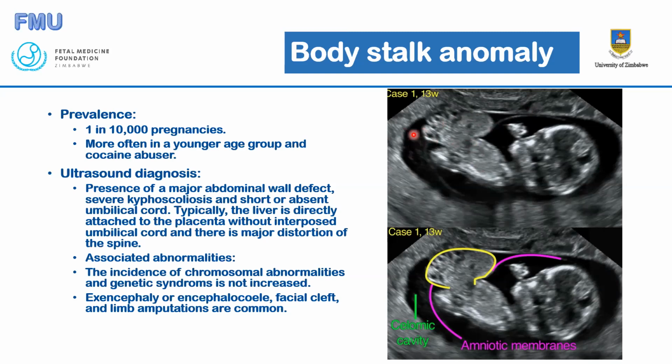This is the chorionic cavity, because the chorionic cavity and the amniotic cavity are separable before 15 weeks, before the chorionic cavity is obliterated. So you can see that there is a rupture at the place where the anterior abdominal wall contents have herniated into.